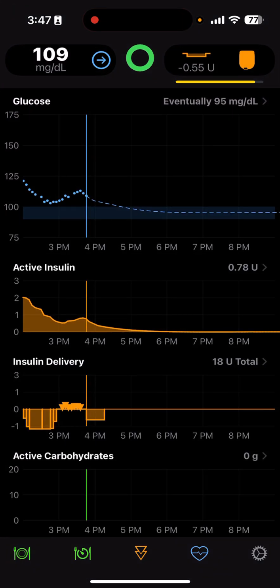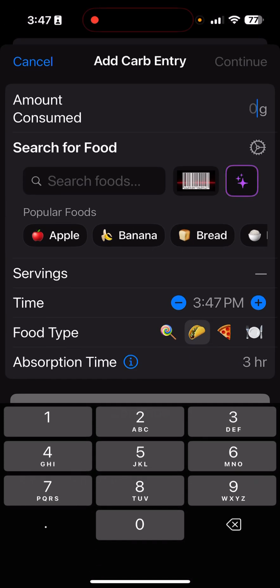Pretty cool. And it does not interfere with any dosing. It doesn't interfere with any regular use of Loop. It is all just before you enter carbs, which we've all been doing manually. And so the coolest thing about this is it gives you important nutritional education along the way, brings it right there where you need it at the moment that you're about to enter your food count or your carb count. And it puts a barcode food library and a diabetic nutritionist right in your pocket.